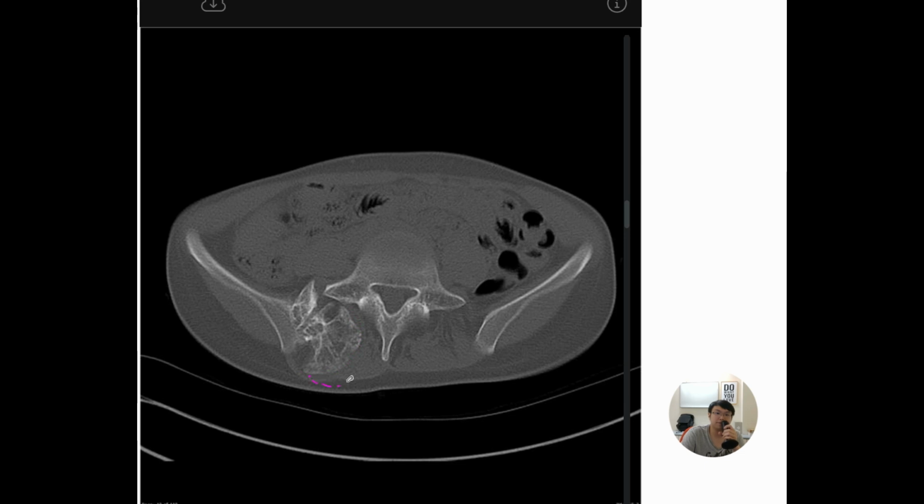One, any abnormal soft tissue swelling which cannot be accounted for by the usual erector spinae muscle. Two, any abnormal ring and arc calcification, which tells you that this soft tissue is thickened and chondral in nature. Three, any erosion back into the cortex of this bony protrusion, because when this is chondrosarcoma, it can erode back into the osteochondroma itself, which is not present in this case.